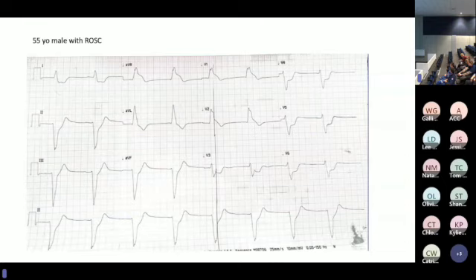So this is just a 55-year-old who's had an ECG immediately post-ROSC. Yeah, I might look at V1. V1 worries me on this person. It looks like a junctional rhythm, can't see P waves, but the ST elevation is massive in V1, which raises the idea of a proximal LAD, which would explain arrest in a 55-year-old.